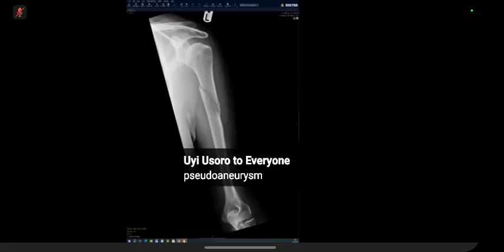This is a lateral radiograph of the humerus of a mature skeleton. I see that there is a spiral fracture of the humerus. The underlying bone appears normal. I would inquire about the history, whether this was atraumatic, most likely minimal trauma. So this is a pathological fracture. I see that there's an underlying abnormality, which is a lytic lesion with a wide zone of transition with the adjacent bone. There is no periosteal reaction. There's no large soft tissue mass.